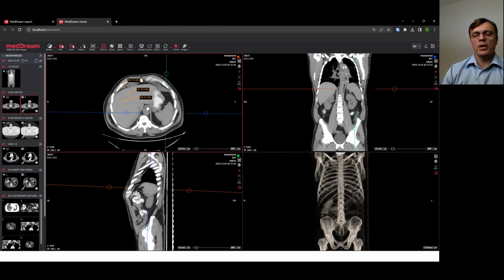Like in the previous version, we got some complaints from doctors when they needed repeated measurements. It really upset them to always move to measurement and repeat the actions. So I believe I presented all the functions which I really wanted to present, which were the most notable in that new version.